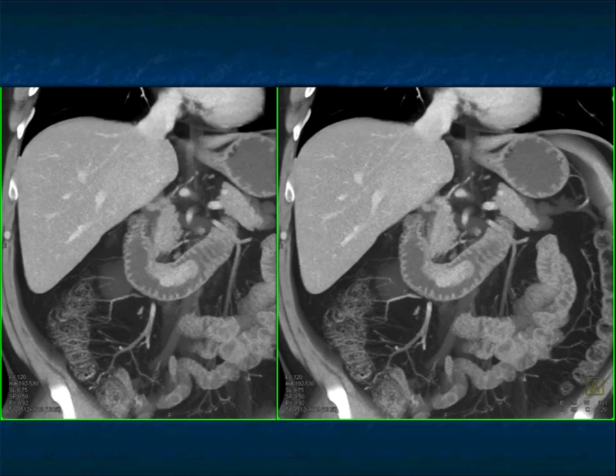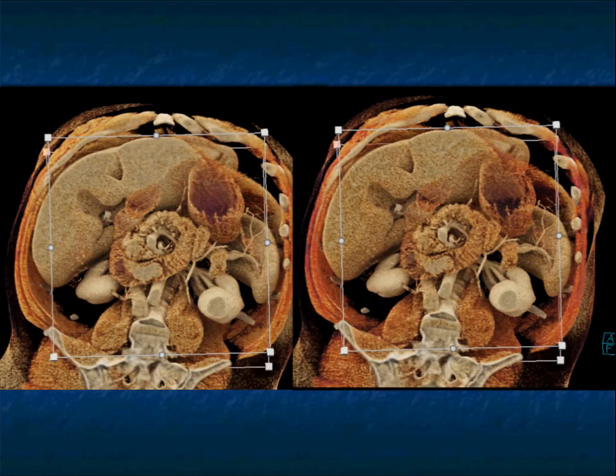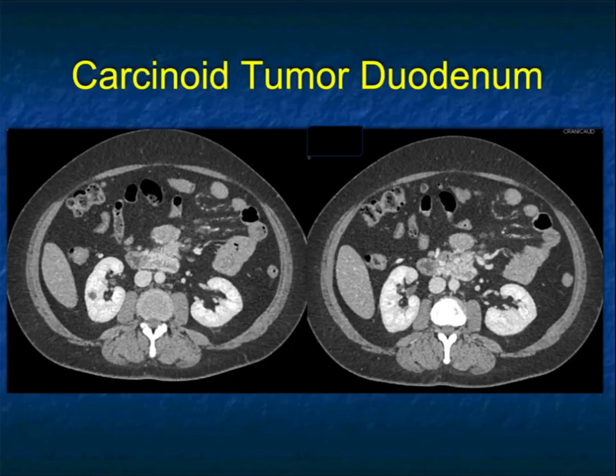Again, 3D imaging can be very valuable. We always make the point that things are often shown better in the volume, and this is just a wonderful example making that point. And here it is on the cinematic, where I'm able to show you the difference in texture of the tumor itself from the fluid as well as the mucosa of the duodenum. Look how obvious this lesion is. And again, one of the things I would like to be able to do is really make cinematic a mainstream process to improve our accuracy. Just a beautiful example in this case.